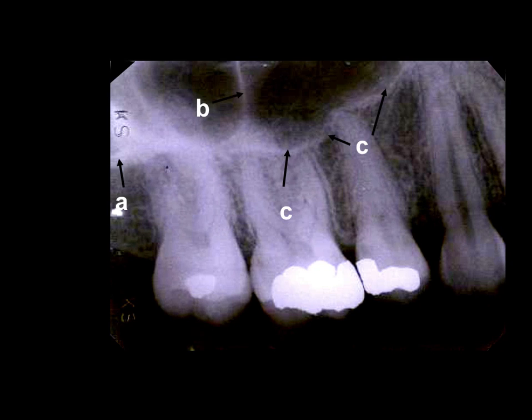At B, the arrow is pointing at a septum, another septum. Remember, we were just talking about that on the previous radiograph. This is a compartment in the maxillary sinus. It isn't going to be completely running through the sinuses. Think of it as a ridge in the wall. C is the floor of the maxillary sinus. In this case, the Y-line of Ennis would be off the film, but it would be in this sort of region here.